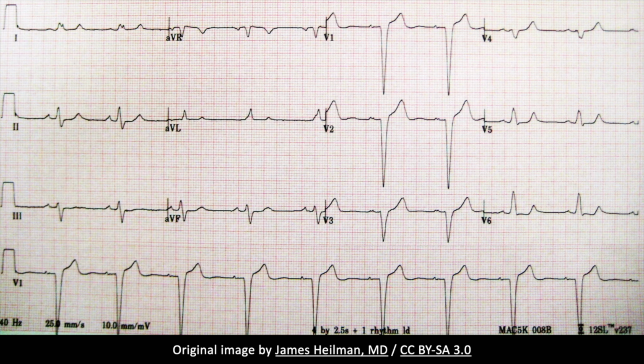Also note that the ST segment and the accompanying T waves can be deflected in the opposite direction of the QRS complex. This is referred to as discordance. Essentially, when the QRS complex is positive, then the T wave is inverted, and vice versa. Finally, with left bundle branch block, the axis is usually deviated leftward. However, it may be normal.